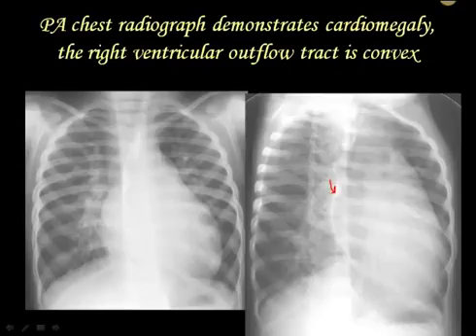They've instructed the patient to drink barium, and the barium goes down the esophagus, and the esophagus is somewhat displaced because the left atrium is enlarged. Okay, there's a few things here. First of all, one thing I want to point out is we almost can't even see where the aortic knob is, but we can see this bump here, which is the left atrium. We also see here, interestingly enough, almost like a double sign, which again shows that the left atrium is enlarged. Now, I'm not asking you to read x-rays at all, but it just makes this a little bit more interesting.